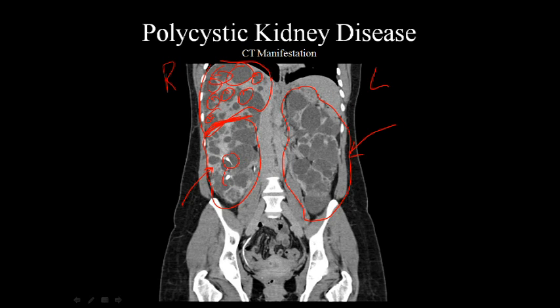But the thing to notice is you have this, this, and this on the right kidney, and so it's corresponding to a ureter cascading down, and you actually see it bore out that the ureter is functioning. So the right kidney still has adequate functionality for this patient. The cause for concern is we have the ureter for the left kidney here, and the ureter does not have a great amount of contrast in it, so possibly the left kidney is not functioning at all.